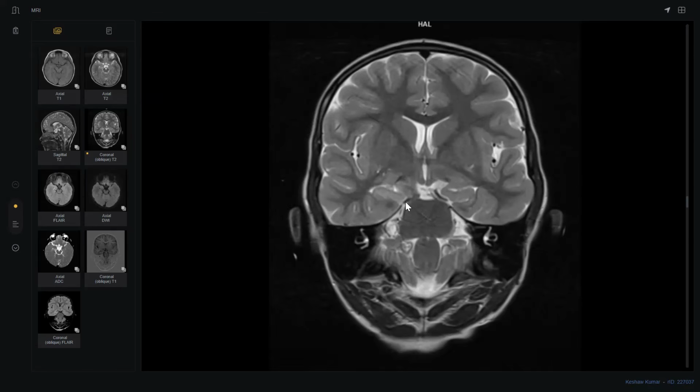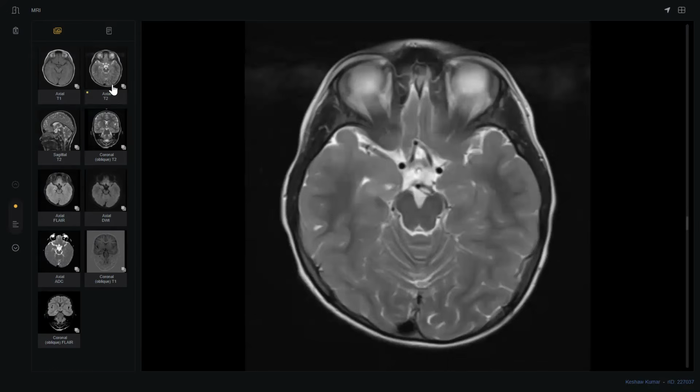There is loss of the normal interdigitation. It is very subtle, but when you are sure you are presented with a case of mesial temporal sclerosis, give as much descriptive detail as possible. Okay, thank you so much, sir. I will give you a very small piece of advice.